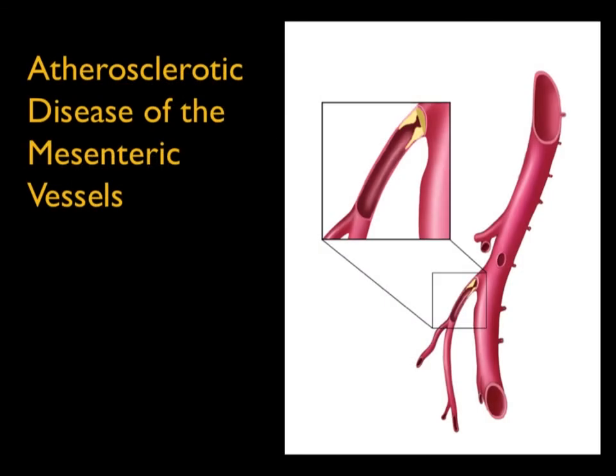We need to make certain we look carefully at the vessels, and so here's just an example of a sagittal view.